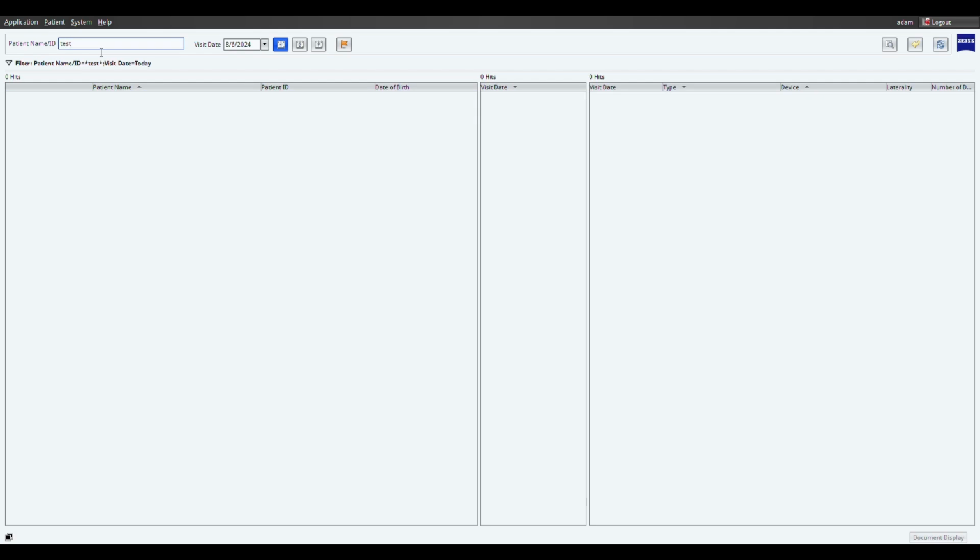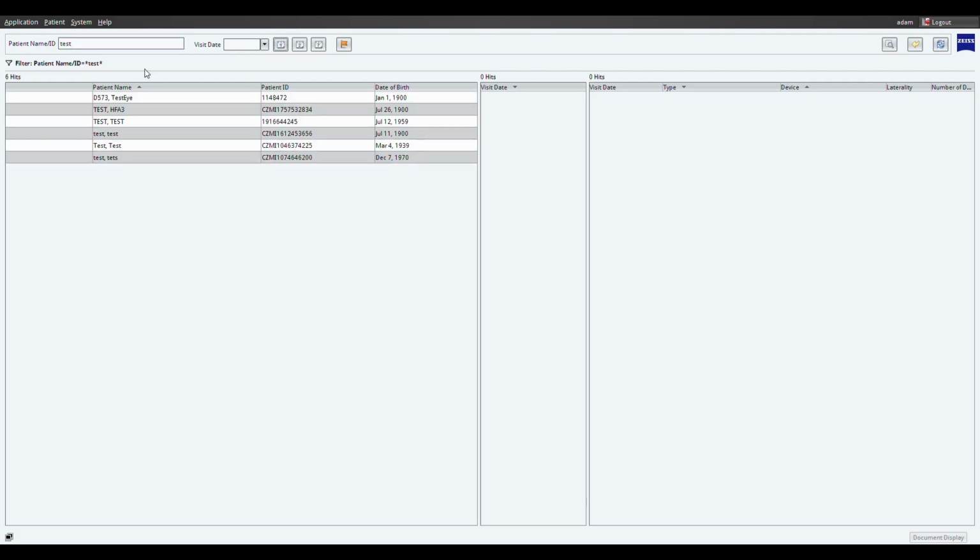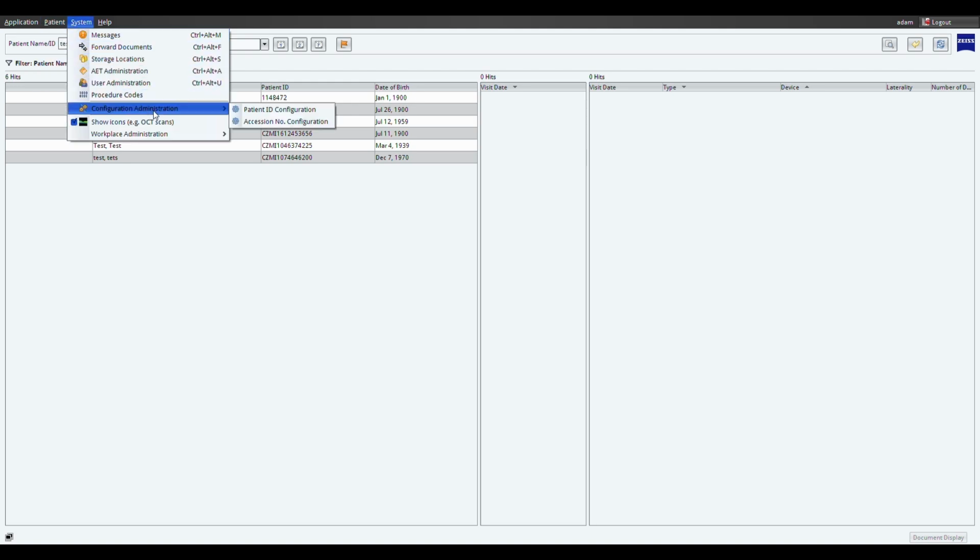The first thing that comes to mind when we think of Forum is usually this advanced imaging software. But Forum is another thing. Forum is actually a very nice and very useful patient administration tool. And we are going to start with this section. So this is what you see when you start using Forum. You have different options when it comes to the interface. You have the patient directory, which is right now. You have the document display if you select a patient. Then you have the work list, you have the patient administration, and you have DICOM import. And of course, you have also the system administration.